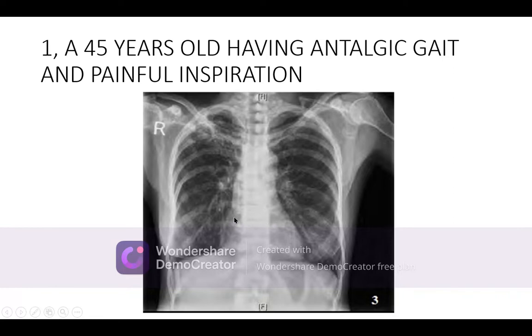Now all bones are affected in this fashion, and actually there are pseudo fractures present in this X-ray, and we call them Looser zones in our terminology. The Looser zones are only present in one condition, and that is a sine qua non radiological finding. So this is a bony skeletal problem which is seen in this X-ray.